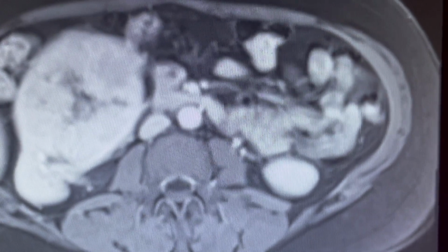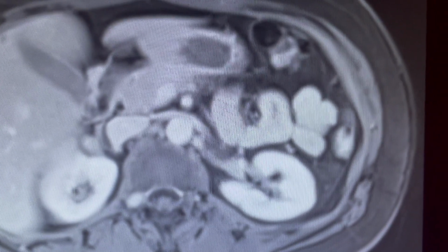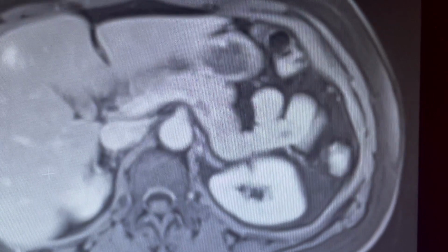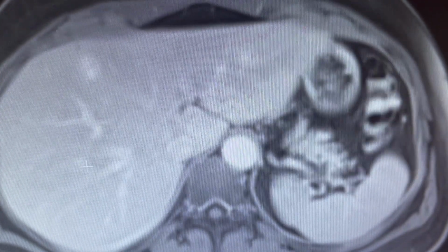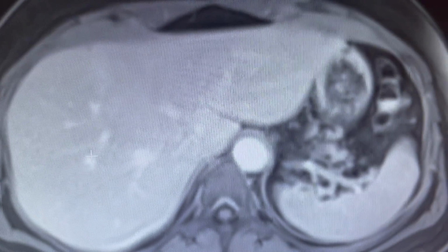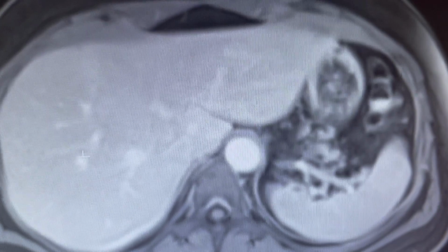Now the next, and in fact now I consider the critical data set for looking for splanchnic inflammatory syndrome, which is inflammation of the splanchnic system. And again, all those tiny hypervascular lesions are not apparent. They have what I call faded to background normal signal liver.